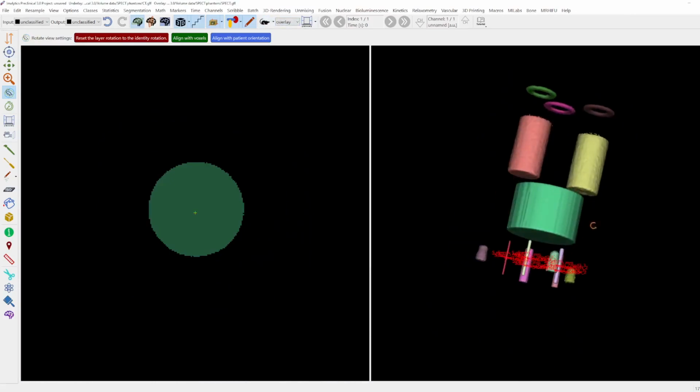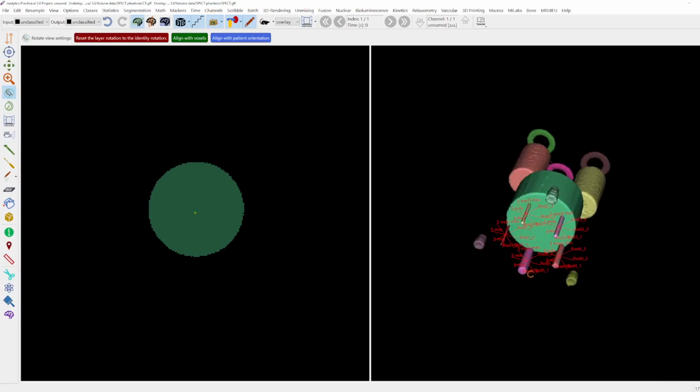Here's the homogeneous region. We have two air-filled and non-radioactive water-filled compartments here in red and yellow. These are rings around the screws. They are needed for the segmentation. And here we have the rods with different diameters and the line profiles that are going through the rods.